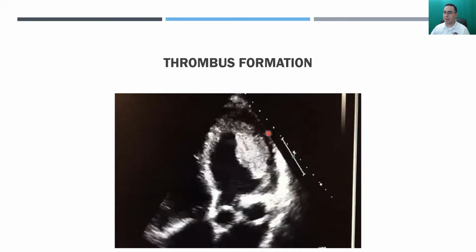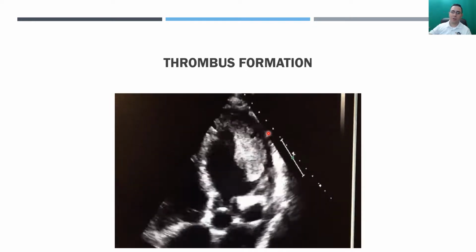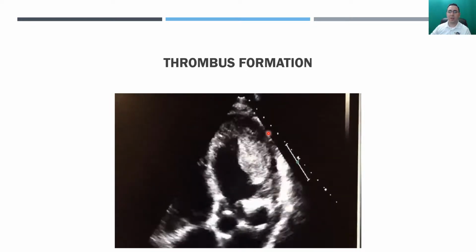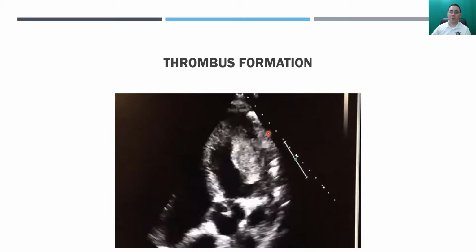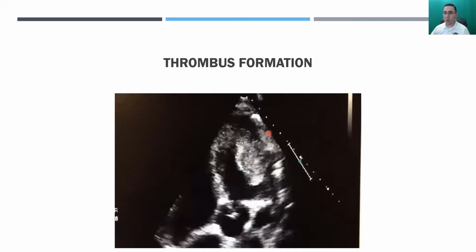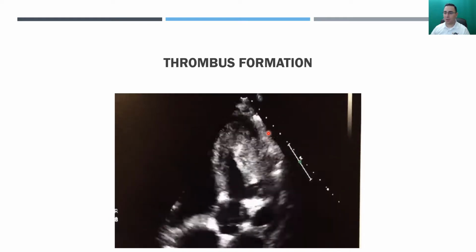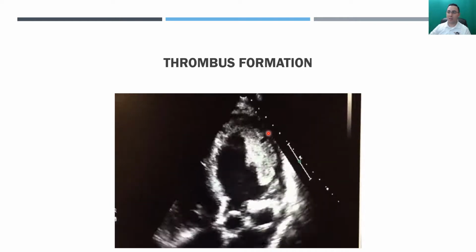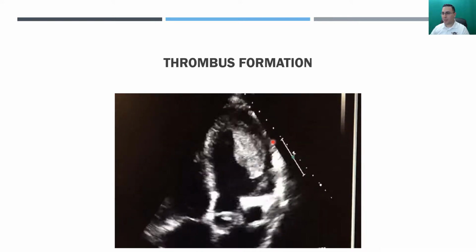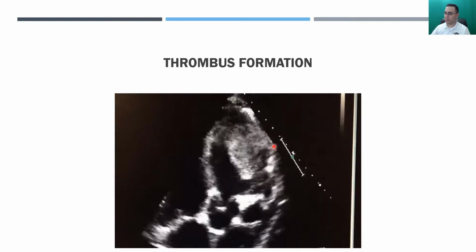You have to be very careful when you're looking for thrombosis, because if you take a look at this video, it may give you the impression that what the patient has is a hypertrophic wall in there, but it was determined later that this was a thrombus in this area, in these segments. All right, so let's move forward here.